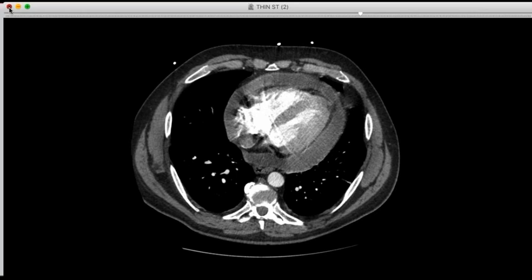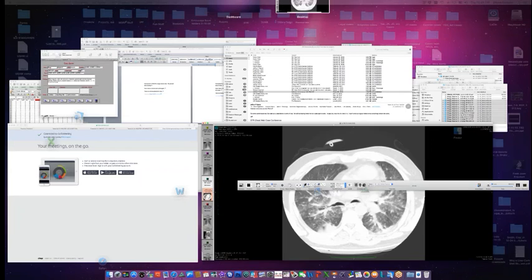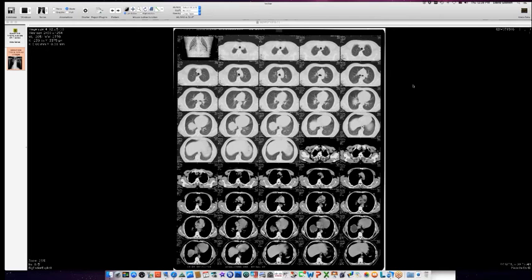Wow. Okay. Jeff, I have 2 more occupational cases, or 3 occupational cases I could show you. Good, because that was my last one. All right, let's see. Okay, can people see an old-fashioned filmed CT that has been scanned? Yes, and it looks like they did it to save film. They got it all in the one sheet. That's right. So small pictures.